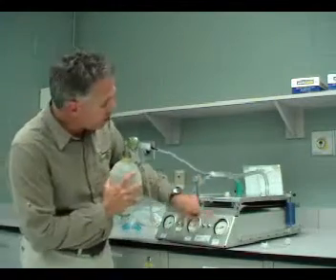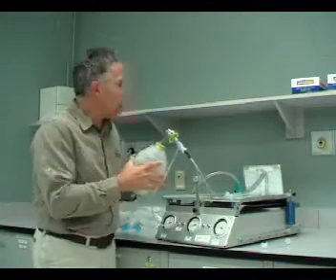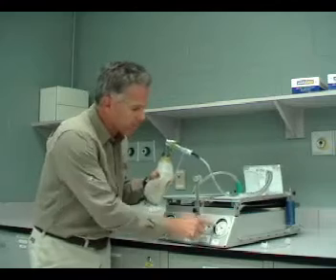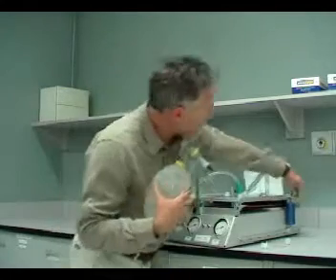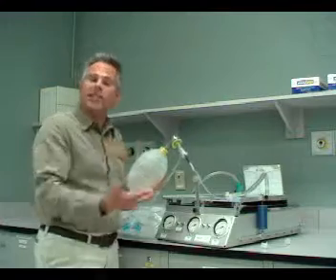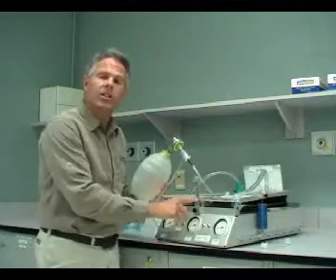And this is reflected on this pressure gauge here. This pressure gauge shows us the pressures inside the lung. This other pressure gauge shows us the pressures here at the mouth. So decreased compliance requires greater pressures to hold the volume in the lungs. Where increased compliance, the lungs are now much more flaccid or more flexible, less elastance, to put in the same volume of gas requires less pressure.